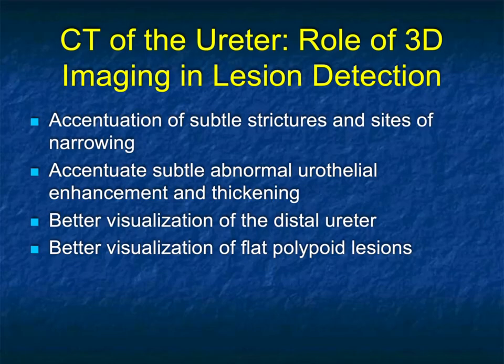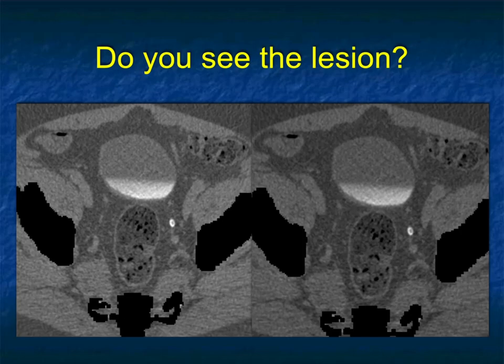I also speak about the ureter in the kidney talk or our lectures on hematuria. It's important to recognize you need to look at the ureters carefully. It's very easy when just scrolling through the images to miss strictures, miss small tumors, miss infection, and even miss stones. So you've got to look very carefully.